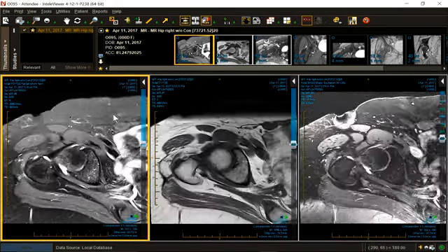Now, I don't like to do just arthrographic studies because then you hide the swelling. So I like to have a pre and a post. But recently, for expediency and for economic reasons, we have stopped doing the pre. But when you stop doing the pre, you do lose the ability to see sites of subtle soft tissue, intra-articular, and skeletal inflammation. So now let's go back to the middle, where we have the mother of all bumps.